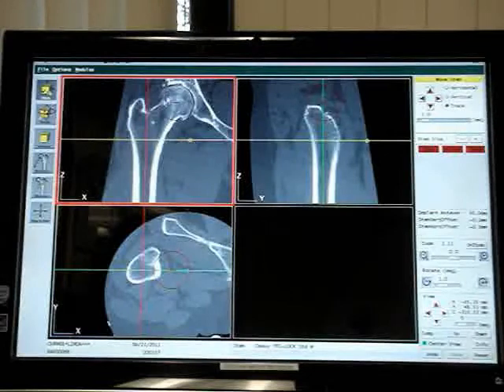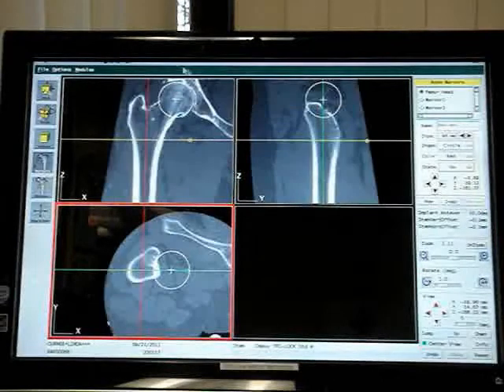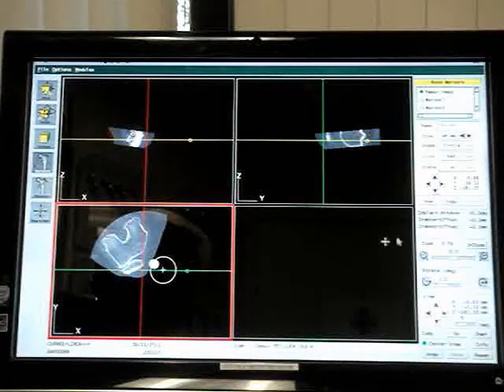And the first thing we try to do is figure out the existing femoral head center in 3 dimensions. I've reproduced the three-dimensional head center of the existing femoral head, and that's usually a good target. Once we have that marked, we also mark the knee. So if we jump down to the knee, you can see we have 2 little red marks, and we've marked both the medial and lateral femoral condyle. And so this is the existing version of that patient. And over here on the right it says it's 30 degrees anteverted.